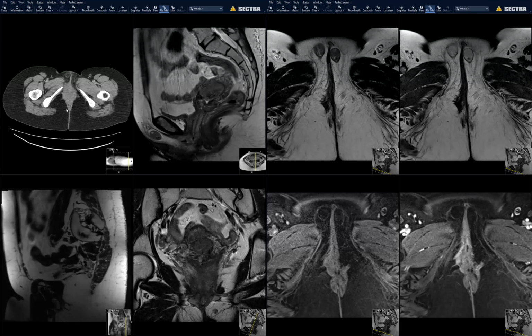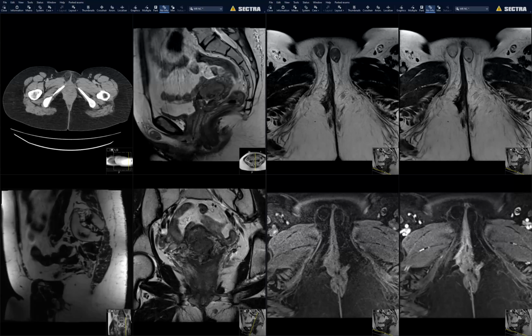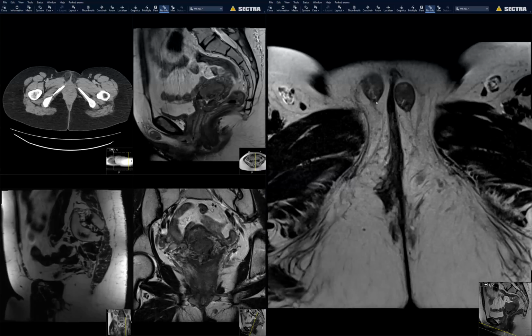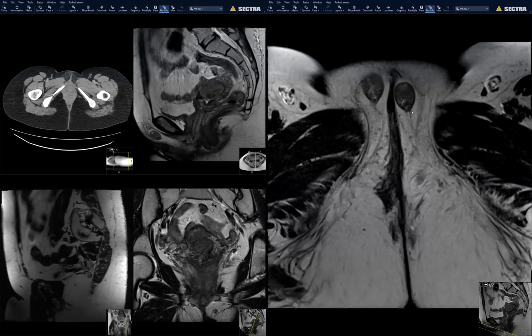But I agree with you now, Kedar, looking at that CT, it is fat. And it looks benign, this signal, but that's what it was. It was there on previous studies, and somehow none of us had looked at it. And on this last study, this just kind of stood out as, you know, balloons.